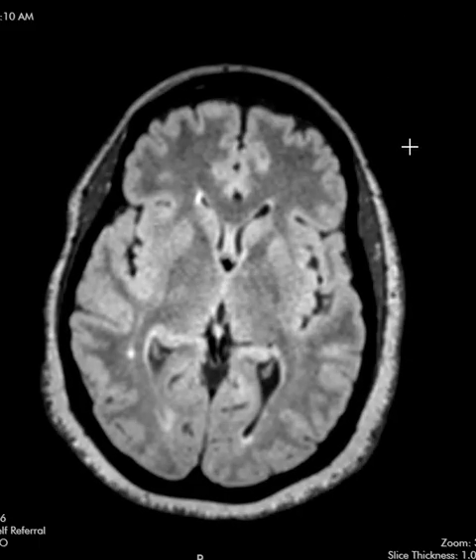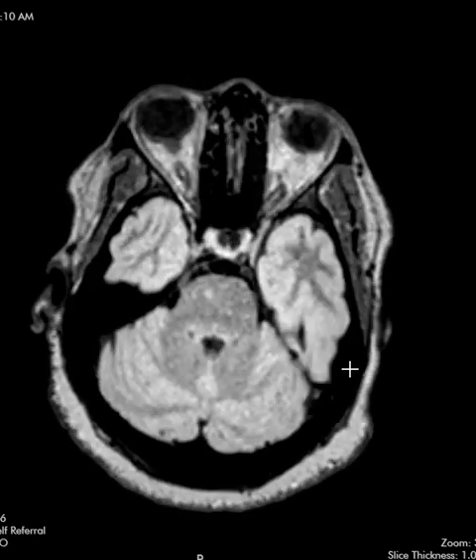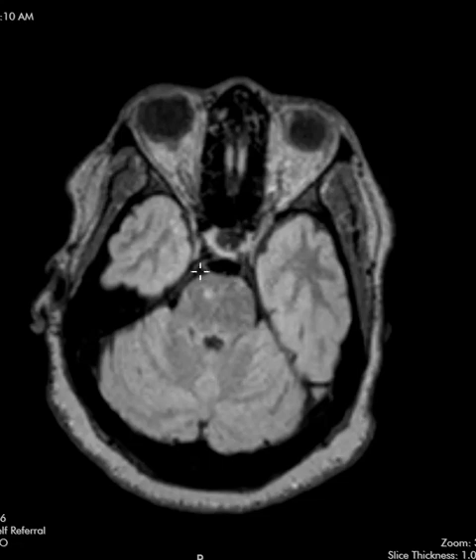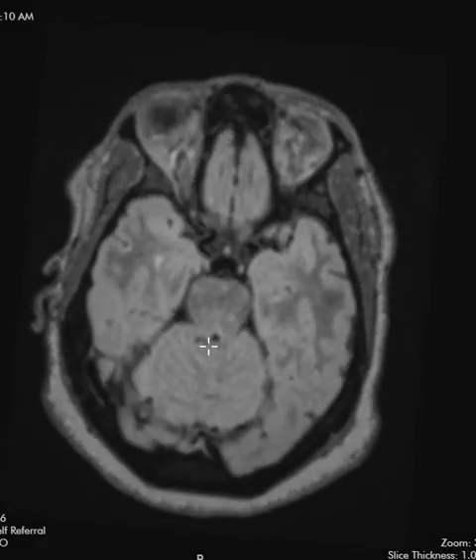So this is a middle-aged female, and as we go down towards the bottom and come up towards the top, we see one of the lower cuts. This is the patient's brainstem, the pons, and this is towards the front. On the right side, we see a little white matter lesion there. When we see small lesions in the pons or medulla, part of the brainstem, very typical for multiple sclerosis. So that is a sign.